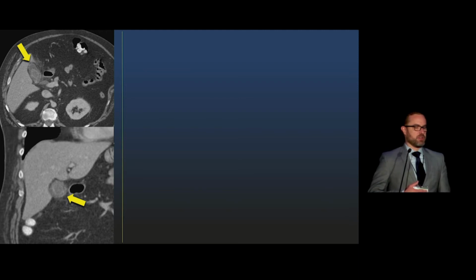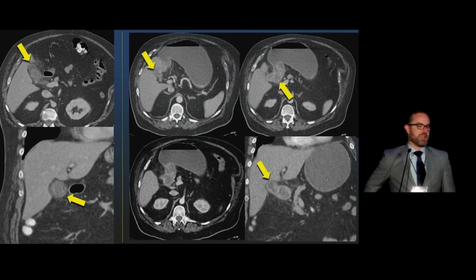Here's a patient who doesn't seem to fit into this talk. This is a patient who has inflammation in the right upper quadrant. There's a non-calcified stone within the gallbladder. The gallbladder is not distended, but there is some fat stranding, and so we thought this was a case of acute on chronic cholecystitis. The patient was managed conservatively and came back several years later with this CT.